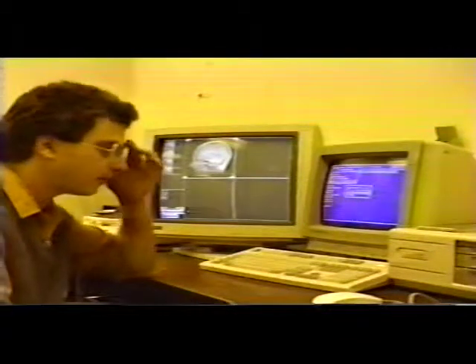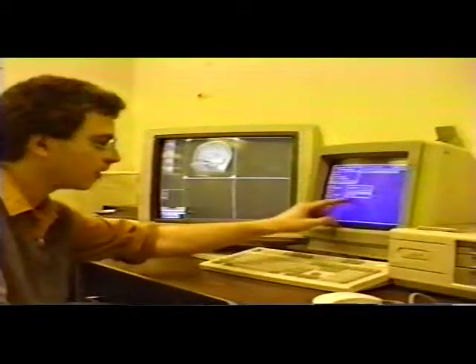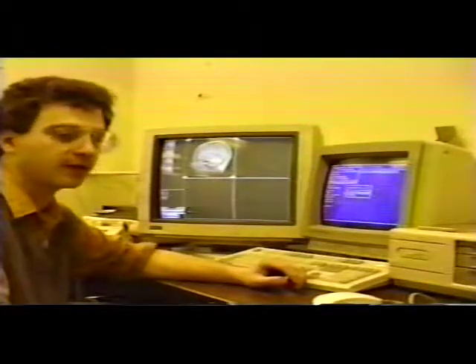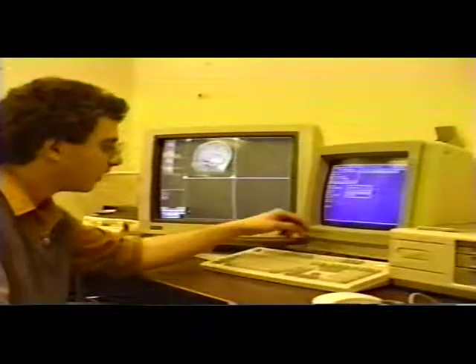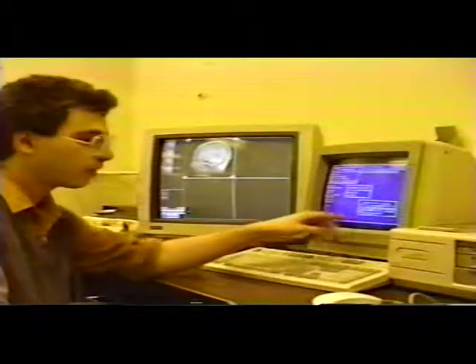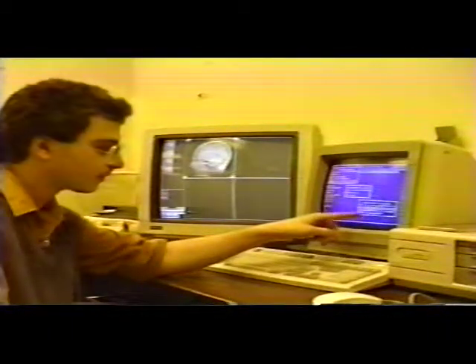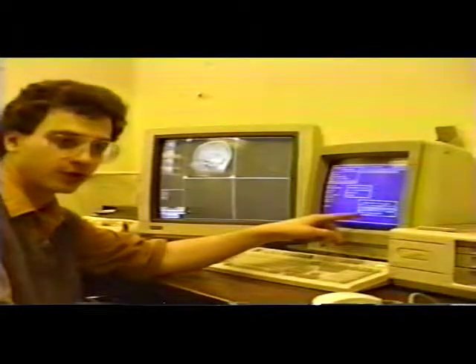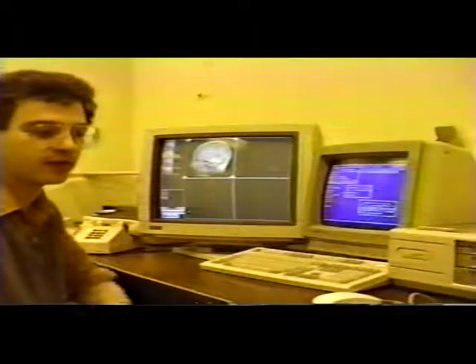If I'm printing an image, I can print just the comments, or I can print all those other pages of the image identification information and the image acquisition information. And I can also print only the current version. I can print all the versions of all the comments, or I can print only the original version as typed when it was entered into the system.